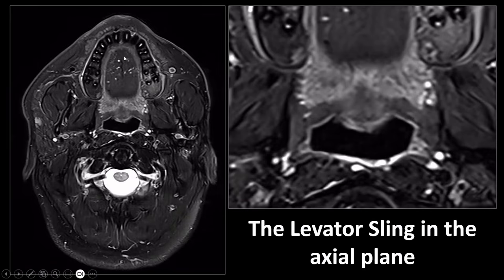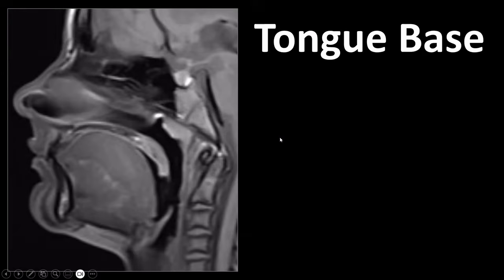Once again, here we see some partial volume of the tongue located against the hard palate. And at the back of it, we see the soft palate, and we can recognize the uvula, which has different signal characteristics, because the uvula is basically composed of two muscular structures, the uvular muscles, and we see the Levator veli palatini forming a sling going to the uvula. Okay, and that concludes the soft palate.